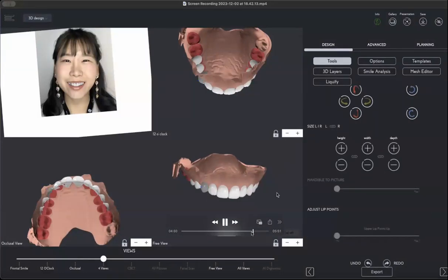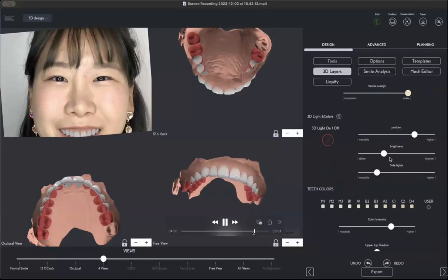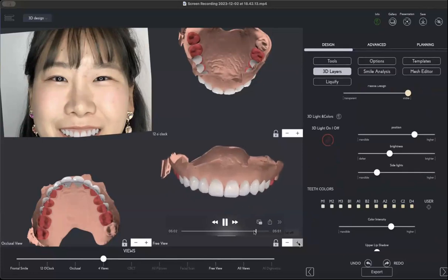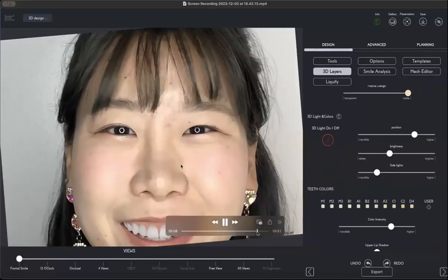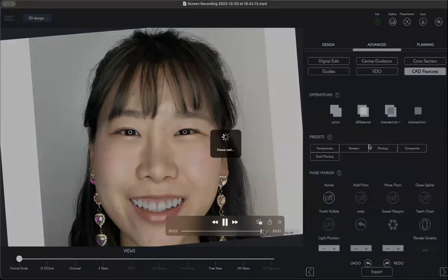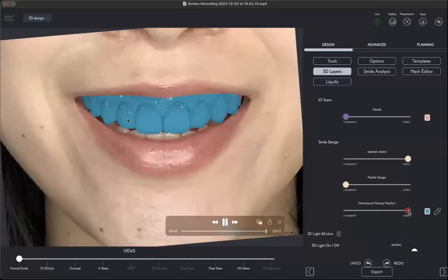It's a very good proposal. It's a very quick proposal, and it's a way to really visualize, print, export the design in minutes, discuss with the patient the form of the teeth, embrasures, changing the templates, comparing different templates in the face of the patient, and then having a design plan for the ideal design, pre-op ideal design, post-op ideal design, and eventually the motivational mock-up. All the stuff here is the mock-up, right? Exported one file, 5 minutes 43.